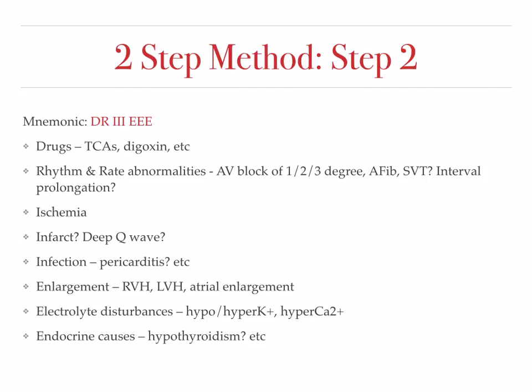Next, could this be ischemia causing this? Maybe there's a possible old infarct. Look for any deep Q waves indicating this. Next, we look for infection. Could this be pericarditis? Next, we have enlargement.